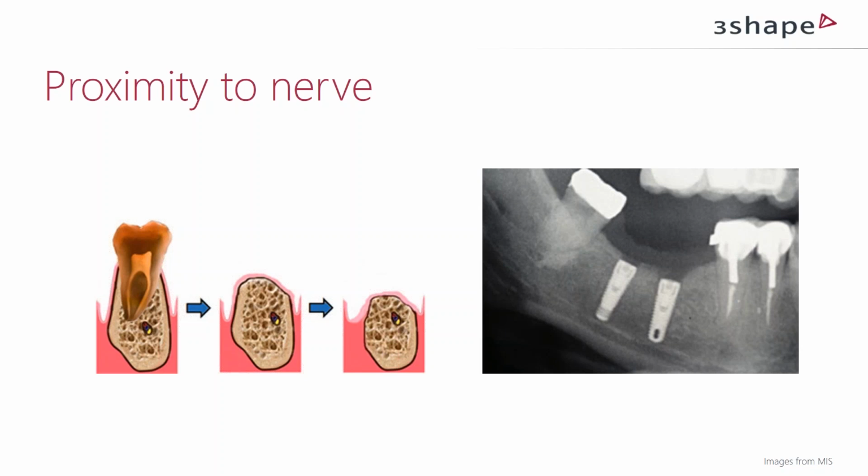It's too narrow already. So the best thing is to not go to partials, but actually to place the implants as soon as possible, when we think about keeping the bone. But then there are other perspectives we have to consider there as well.